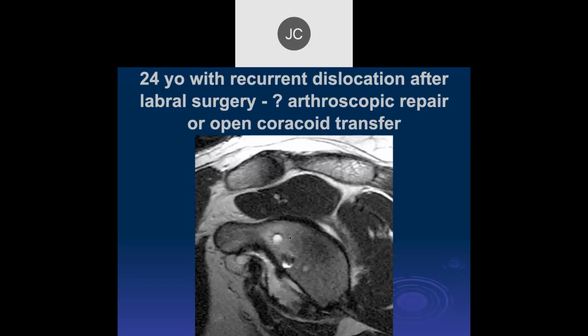So it looks like I'm not sure exactly what's going on here. Those are suture anchors, but the injury is down here. These suture anchors are pretty high up. Okay. So you can see the flattening. This is a bony Bankart injury down here. Right? Okay. So nowadays, this is before we had the current concepts.